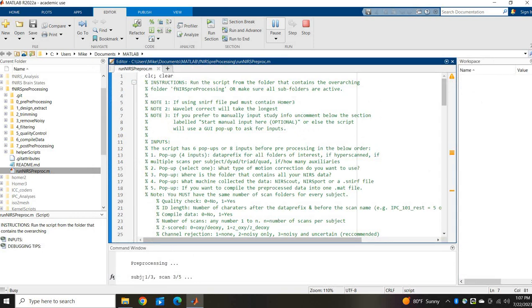So great. Again, down here you know where you're at, which is nice. If you have a really big data structure and maybe you're doing wavelet, it's going to take a while. So you could go and do other things and come back and see where it's at. But we don't have too much data, so it should be pretty quick. All right, so 20 seconds, not bad.